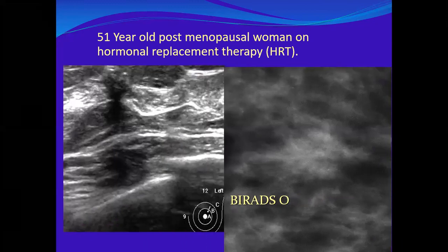That is the ultrasound. So that was the ultrasound. Accurate. In the ultrasound, okay, there is a small spiculated BI-RADS 5 lesion with cutting sign. I can see. Yes, this is highly suspicious. This is BI-RADS 5 with posterior shadowing. I cannot say.